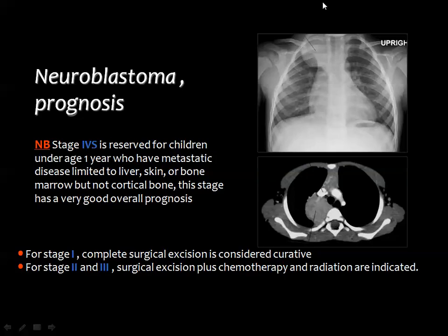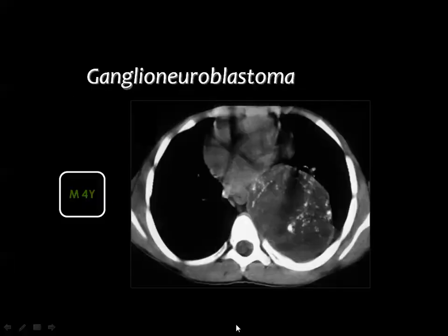This is another example of neuroblastoma in the posterior part of the superior mediastinum. There is some maturation of the neuroblastoma into ganglioneuroblastoma. And here you see a mass showing the criteria of neuroblastoma, being posteriorly located and containing calcium in the paravertebral gutter. The age of the patient is 4 years, suggestive that this may be a ganglioneuroblastoma, but is not conclusive.